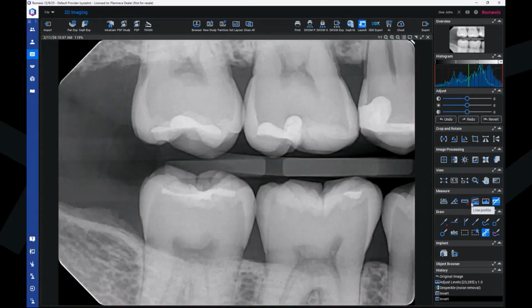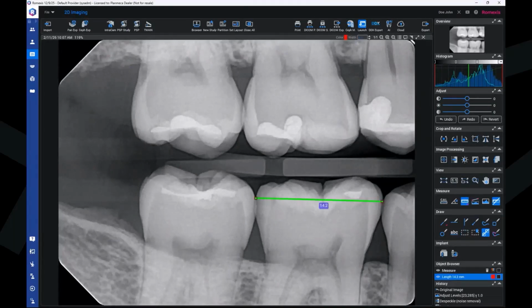there's the angulation tool, there's a line measurement tool. In Romexis, you will see also in different modules we have this small red corner triangle, and that means that behind this tool there are other tools as well. So you have in the same button measuring single length and measuring polyline length. But let's do, for example, a single measurement here, like that.